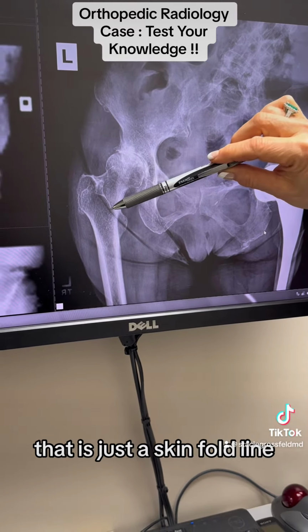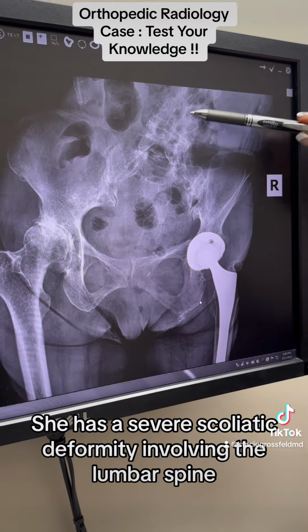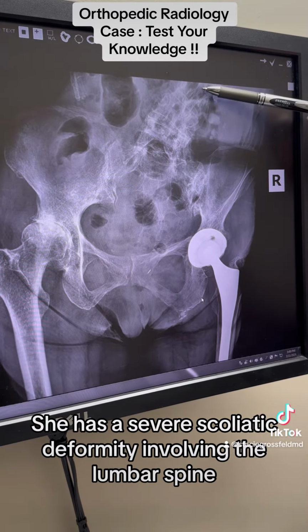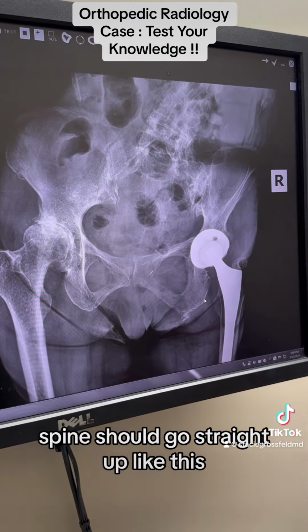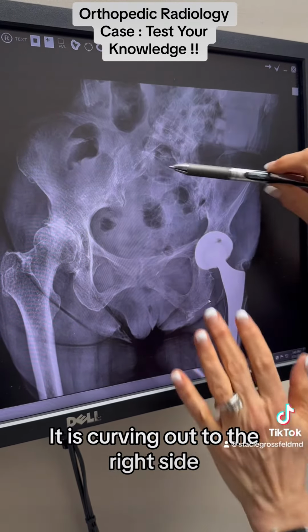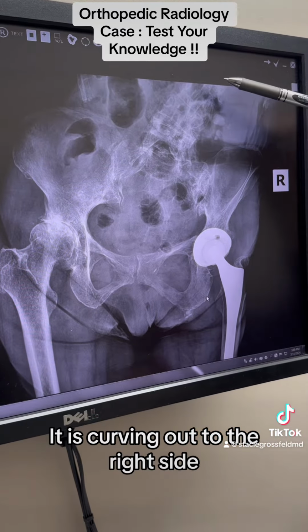Now we're going to move up into this area of her spine. She has a severe scoliotic deformity involving the lumbar spine. In this area, you can see where instead of the spine going straight up like this, it is curving out to the right side.